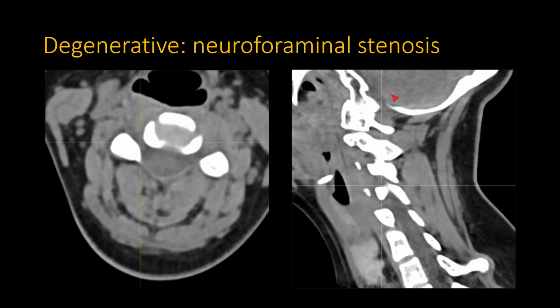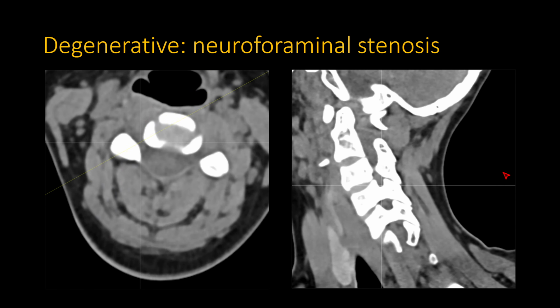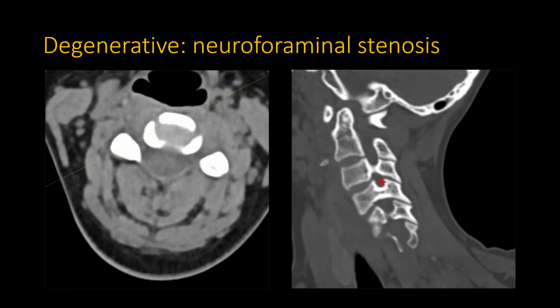You have to wait a second for it to go into 3D mode, and then you turn it so that you're obliquing this reconstruction until, yeah, now it's pretty good. If you look at this yellow localizer line, it's now oblique so that it's going straight through the neuroforamen. And as you can see now, you're going through the cross section of the neuroforamen very nicely, and you can see the whole cross section. Nothing's encroaching on it, no end plate osteophytes, no facet osteophytes. You can change your windows even, if you want, etc. There's nothing encroaching, and this neuroforamen is perfectly normal in caliber.